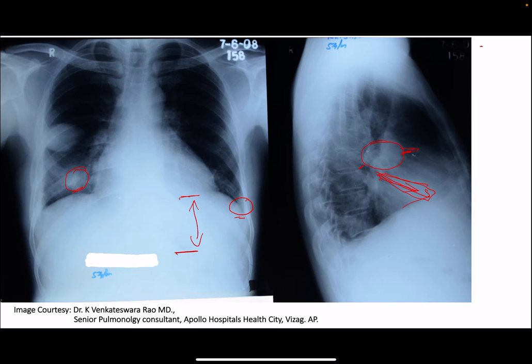But you should clearly see, this is very important, that the distance between the fundic bubble and the lower end of the lung field is increased, indicating a subpulmonic effusion. So you should always think of a subpulmonic effusion. And also based on the location, see, this is the fluid accumulation in the horizontal fissure, and this is the fluid accumulation in the oblique fissure.